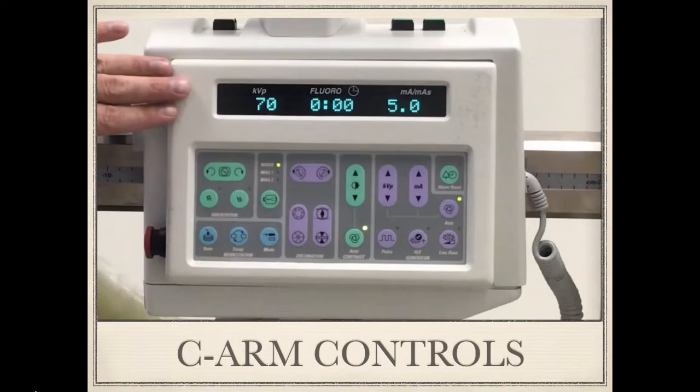Now, just one last section left, which is this top one. This is to do with the alarm. So let's say the alarm is set at 5 minutes of radiation exposure. When you have done 5 minutes of radiation exposure, this alarm will sound to warn you about the amount of radiation exposure, or the time of the radiation exposure.